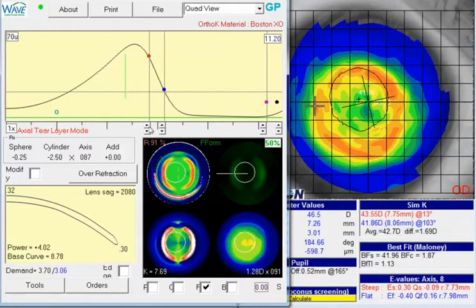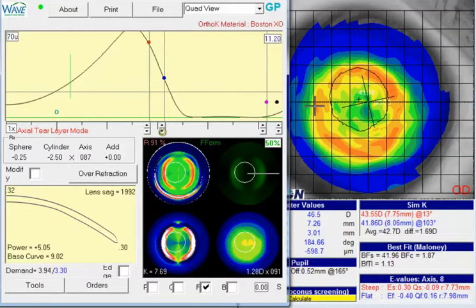And again, we'll do the same thing because we're in freeform. And I'm just looking for a point where we get a more normal reverse curve, and that looks a little bit better.